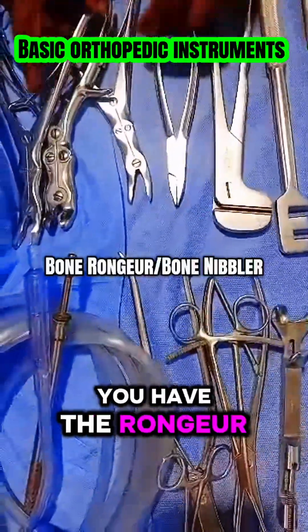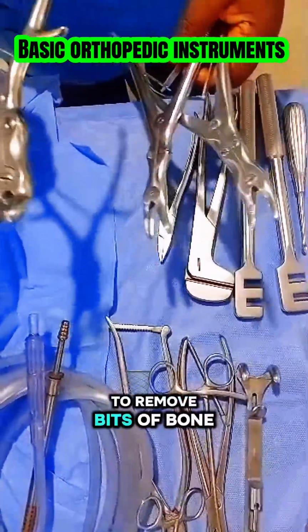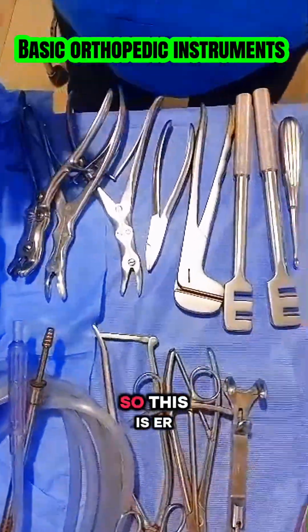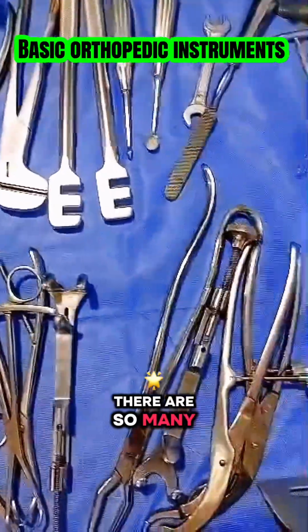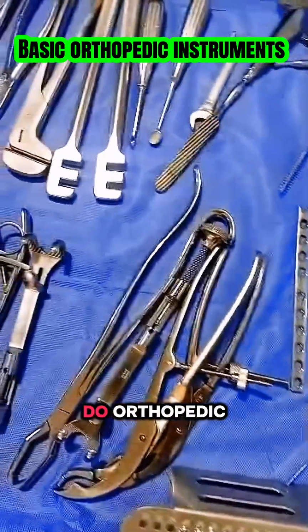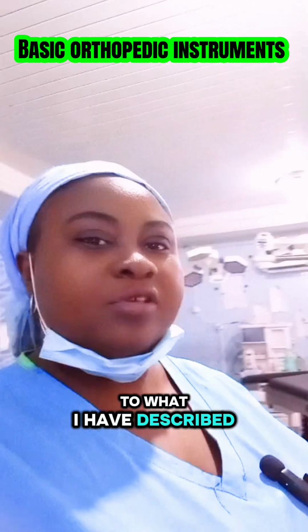Then you have the rongeur. This one is known as rongeur or bone nibbler, as the case may be. So it is used to remove bits of bone, pieces of bone. You can use it and remove it. So this is all about basic orthopedic instruments. There are so many instruments relating to orthopedics, but I've just shown the basic ones that you need when you do orthopedics. And the basic orthopedic instruments, we have just described them. They are not limited to what I have described.